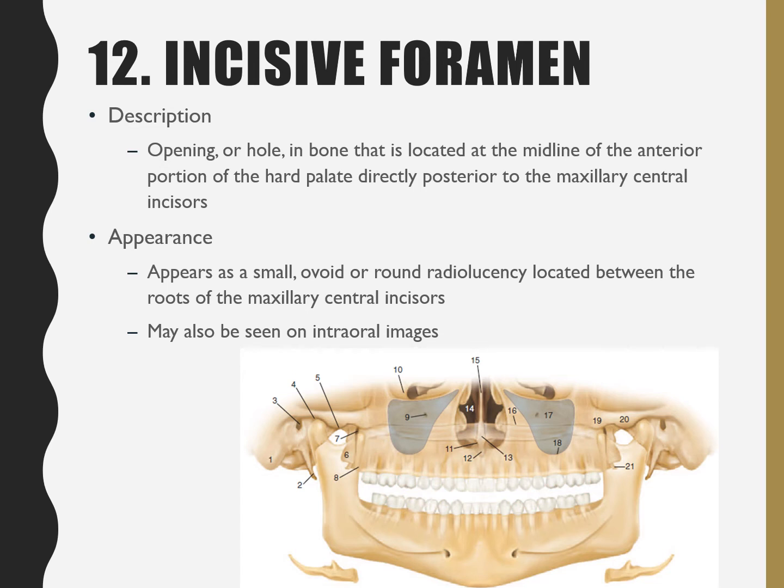So number 12 here, you can see it right between the two apexes of your maxillary central incisors. You can see that little roundedness. That is the incisive foramen or the nasopalatine foramen.